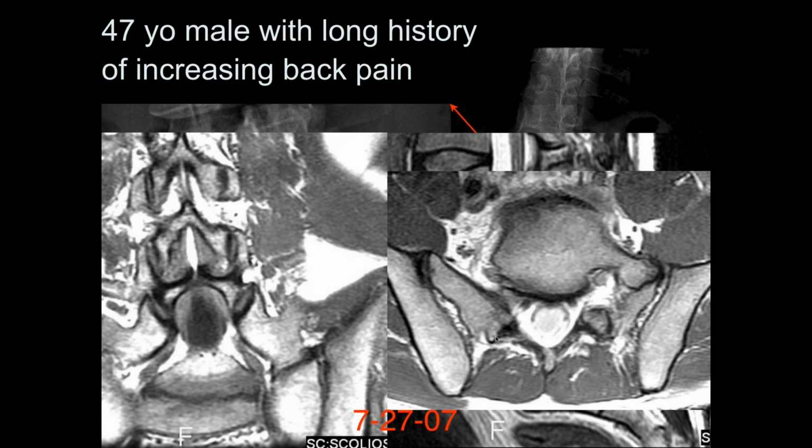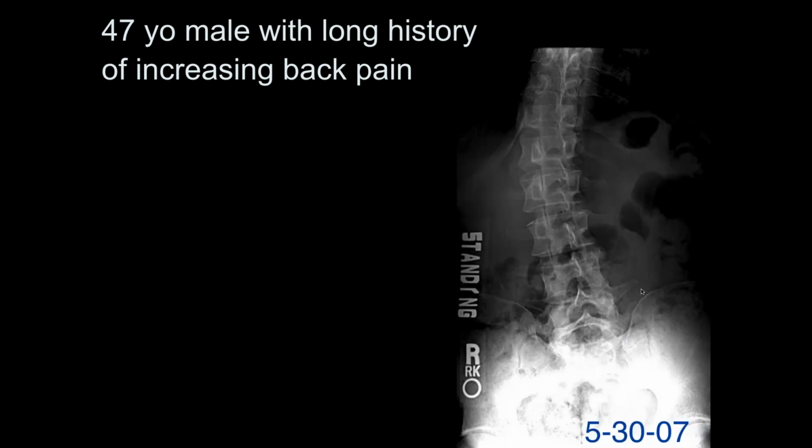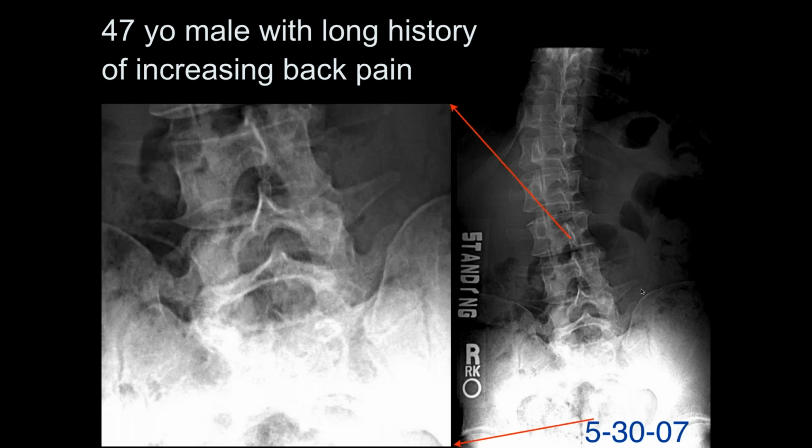And then, yeah, it looks like there's an articulation there between the... And then you can see here, we can also see on the axial images at the L5 level, there's an articulation on one side that's not on the other. And this is on 5/30/07, at the right side.